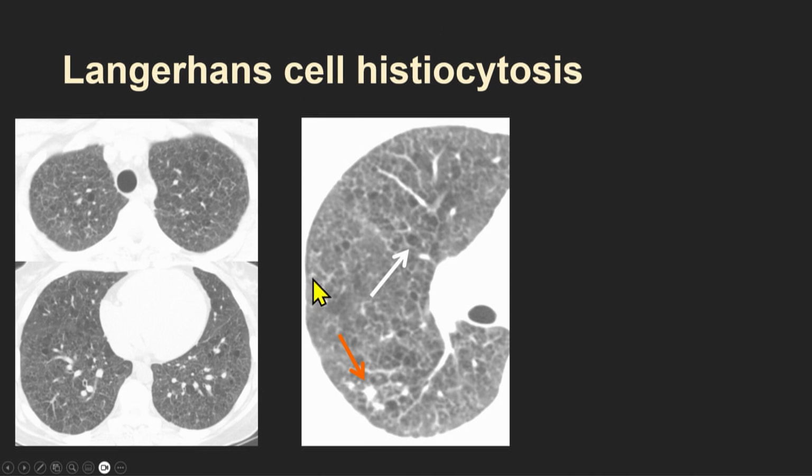That is not a term that you'll find in the Fleischner guidelines, but this is a term that I think most chest radiologists will use, this burnt out pattern of Langerhans cell histiocytosis. So this patient's inflammatory phase of LCH has evolved into not just a cystic lung disease, but also some degree of fibrosis. And so not an uncommon pattern here. If you keep your eyes open, I'm sure you will see one of these cases in the next couple of years. It is not that rare for this burnt out pattern of LCH to happen.